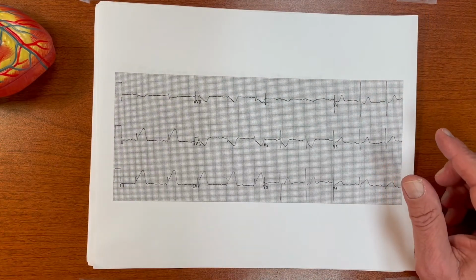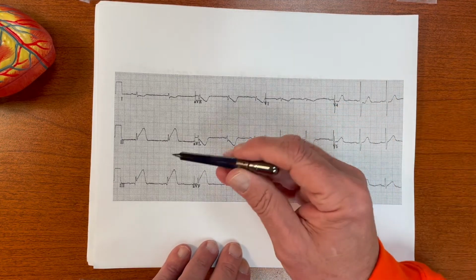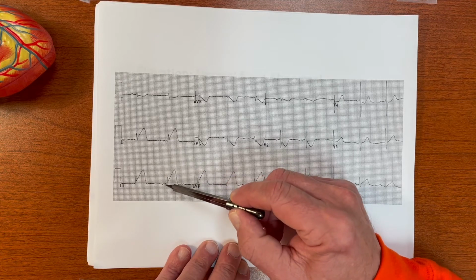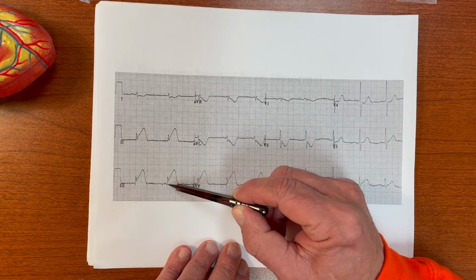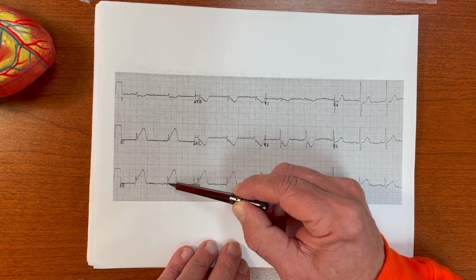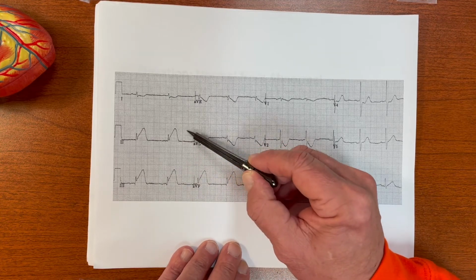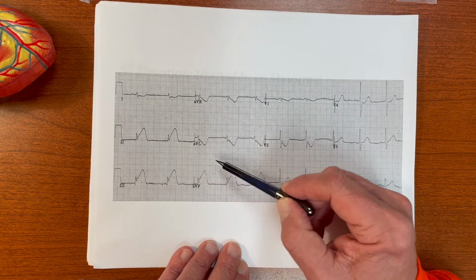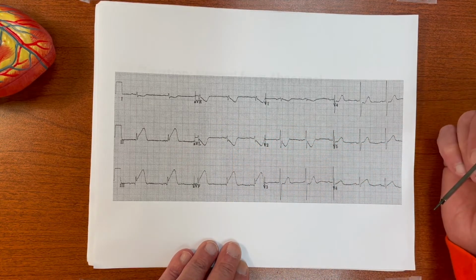Here we can clearly see that the ST segment, here we go, there's our PR interval. The J point is up over a millimeter. Remember our criteria. This is several millimeters. Each small box is a millimeter. Several millimeters. Frowny face, morphology. Convex. Okay. And in leads 2, 3, F.